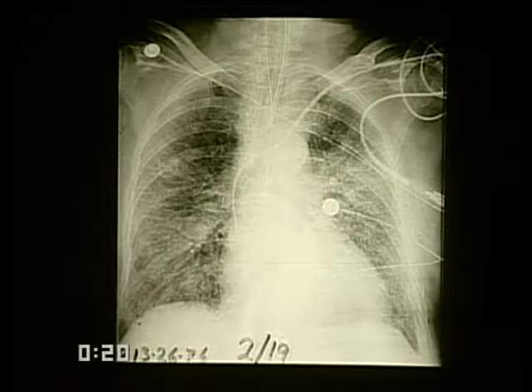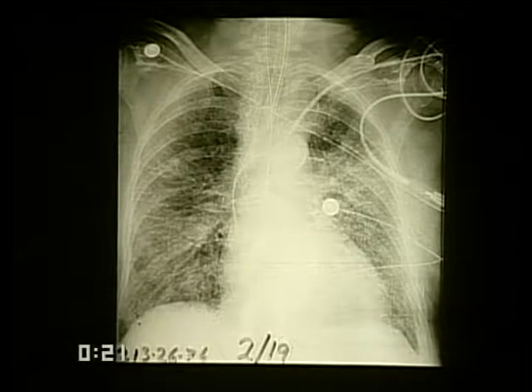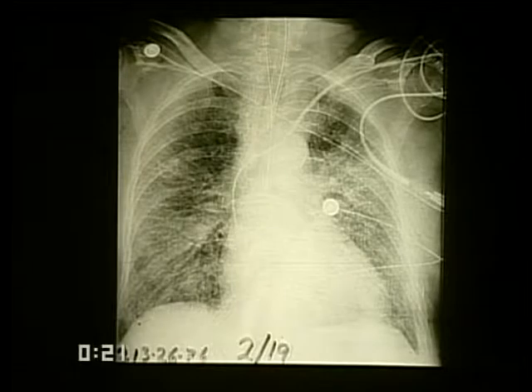However, if you look here, you will see air bronchograms. Air bronchograms are noticeable for their paucity in uncomplicated pulmonary edema. We really should suspect some other disease if we see air bronchograms in something that looks like edema. This is a patient with the acute respiratory distress syndrome, or ARDS, in its acute exudative form.